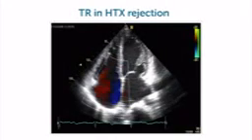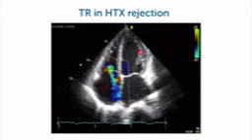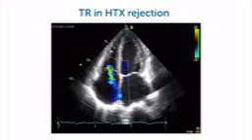So in all of these cases, the tricuspid valve does not really have a structural problem. It's all what we call secondary or functional tricuspid regurgitation. The right ventricle has a problem, and as a consequence, the valve is incompetent. One last example, a patient who had tricuspid regurgitation following transplant rejection. This is a transplanted heart. Left ventricular function is poor. Again, the patient develops pulmonary hypertension and tricuspid regurgitation.